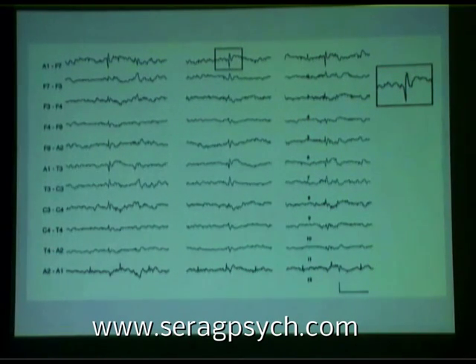But it can be a problem distinguishing those from anterior temporal spikes. Now, what we always try to do in EEG is prove to yourself that you have two different kinds of phenomena here: anterior temporal spikes in some patients, and then small sharp spikes as well, okay?